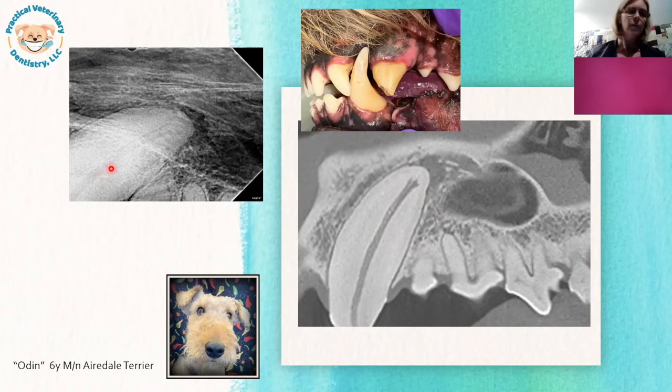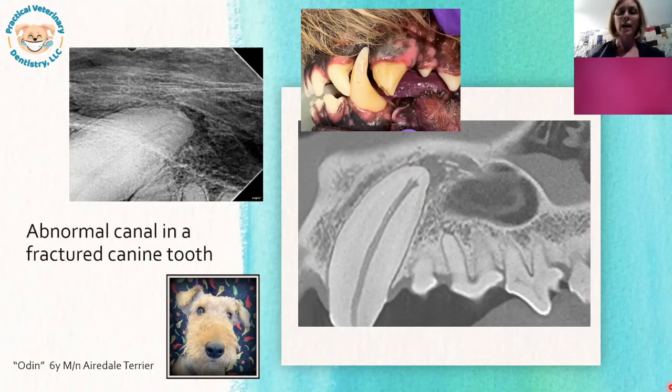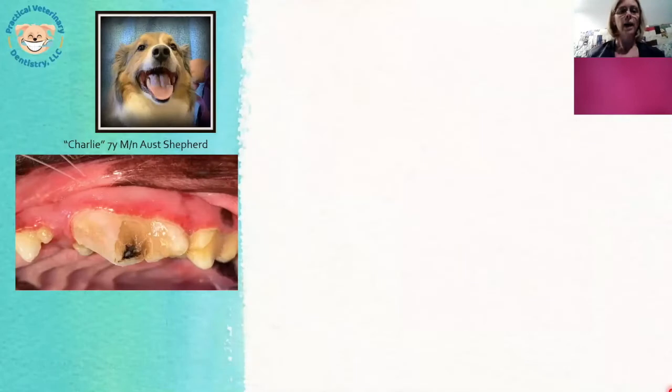And if I look back at the radiographs, I can make myself believe that I think I can see that there, but honestly, it's not something that we noticed prior to having the CT to be able to see. And you just wouldn't normally think to do a CT on every root canal. But I'm finding actually quite a few situations where I'm very glad that I had it and had that information.